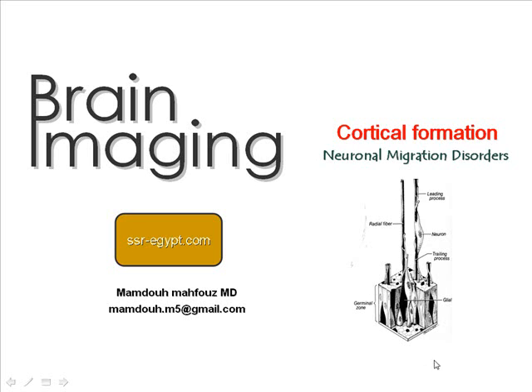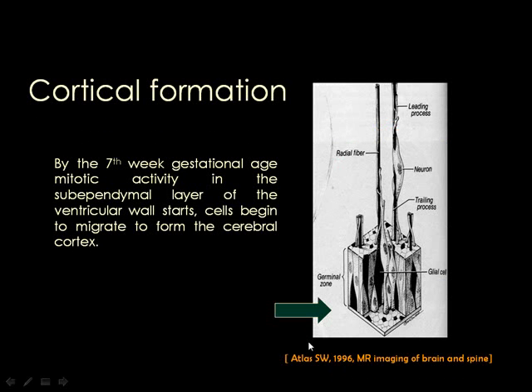The next talk in this session will be about the imaging of cortical formation disorders, or the disorders of neuronal migration. This is actually a topic which has emerged after the introduction of MRI in clinical practice. Many of these lesions were missed before the era of MRI and are now accurately diagnosed with the help of this new imaging technique.